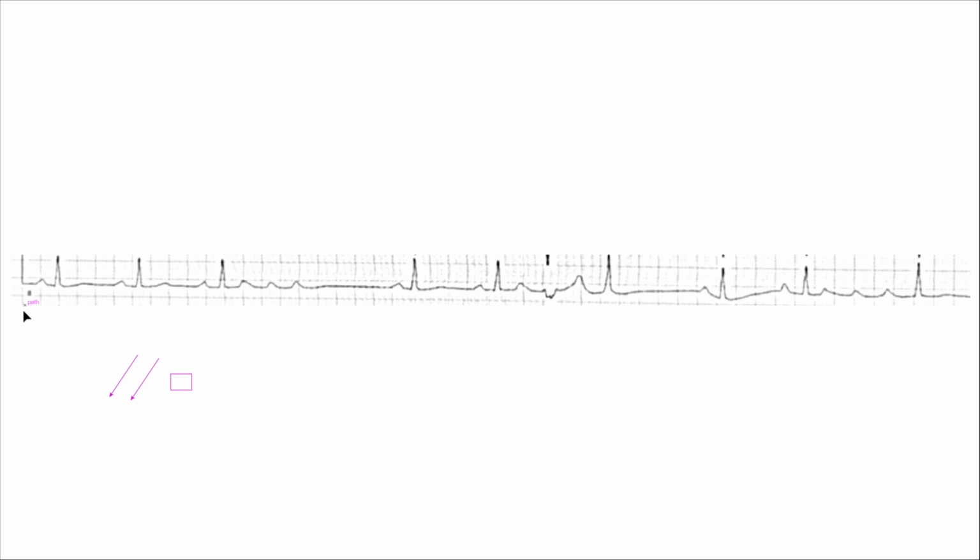So here we're looking at a single channel, right? So this is an ECG strip. The best you can hope for is to get a little rate, a little rhythm off of this. And of course, anytime anybody asks you the rate, you gotta think in your head, the rate of what, right? Rhythm, if we get lucky, maybe we'll figure something out here.